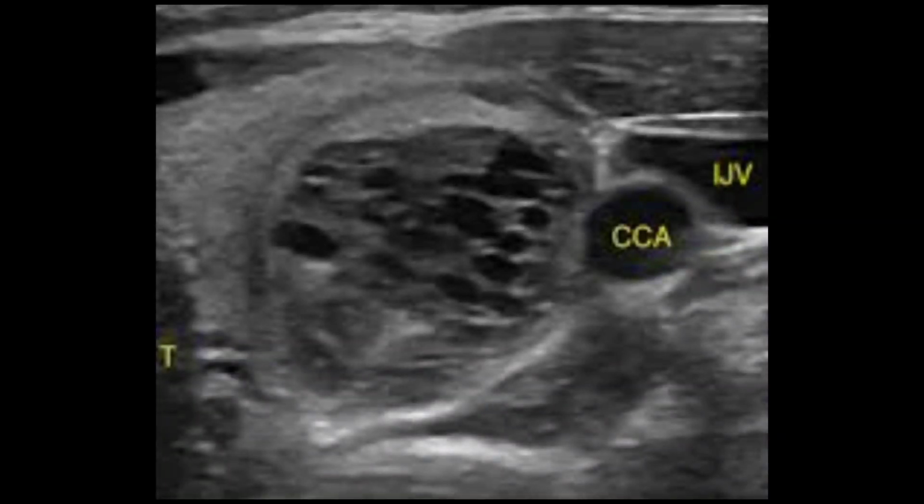Have a look at this nodule for better clarification. This is again microcystic changes within the nodule, and this is also termed spongiform appearance. If you write microcystic appearance within the nodule, or you apply the word spongiform appearance, which would be highly characteristic. So this is a benign nodule. This is a characteristic of a benign nodule. So this nodule would be classified as a U2 nodule.